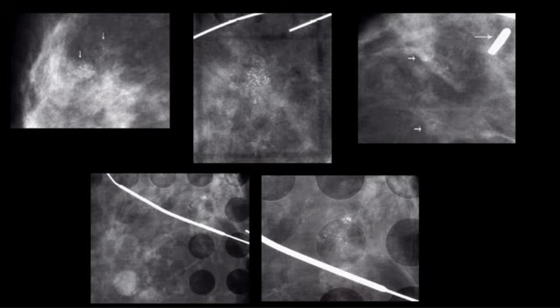This is ductal carcinoma in situ, low and intermediate grade with no necrosis, so that's good. We can see here on the first an MLO spot compression view. There are some amorphous calcifications at the edge of the arrows here and there. Tightly packed punctate calcifications are present, and this is a spot compression magnification view of the lumpectomy site 5 years after surgery. They did a lumpectomy here.